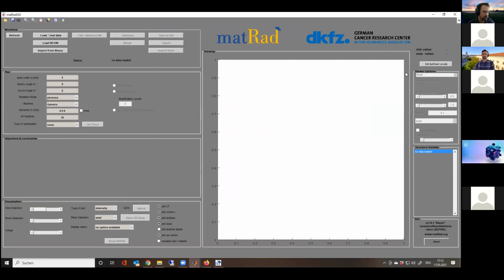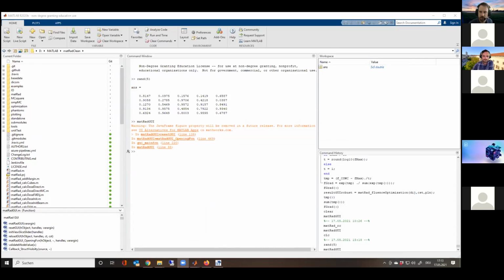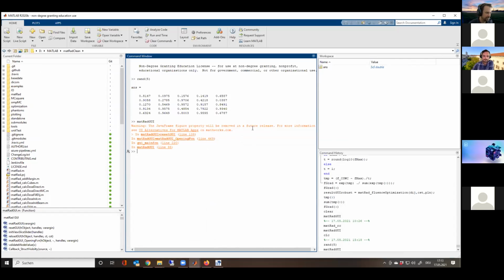The rest teaches you how to use code. So in between sessions, or during the tutorials, I will minimize this and do something in the code, like call some function or set some parameters and so on. And then you can follow this. But this will be something that basically shows how people with code and MATLAB will do it.